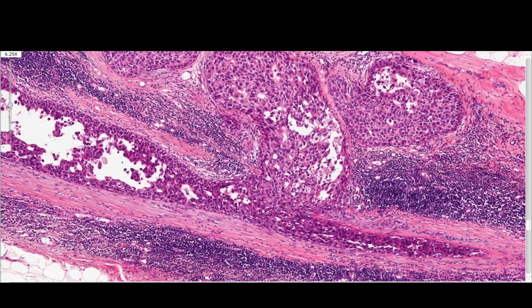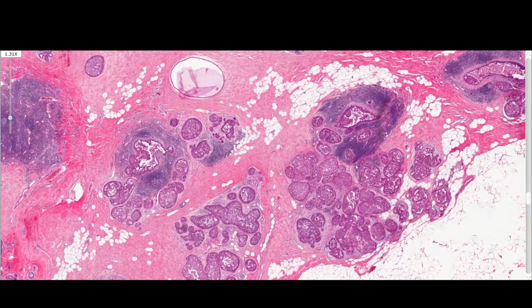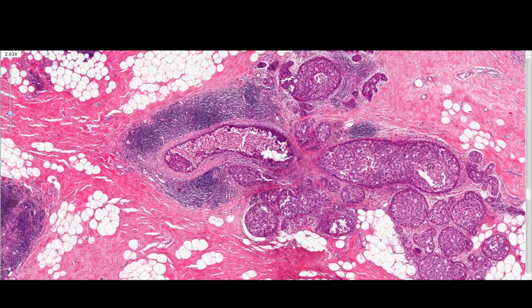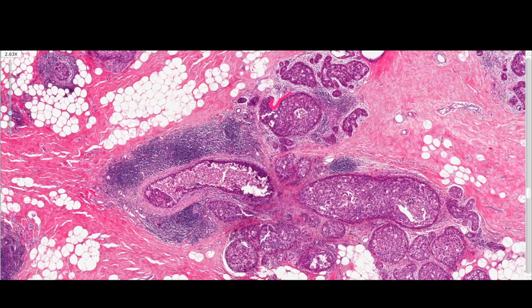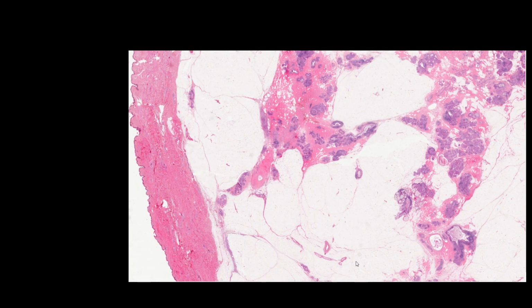Look at the cancer cells streaming out from inside the lumen of the duct. But there are many other neoduct genesis images here, because this specimen had a large number of newly formed ducts, duct-like structures. Also, the acini were full of cancer. Wherever I touch with my pen, I see neoduct genesis. Because of this extensive nature of the disease, the MR was very positive.